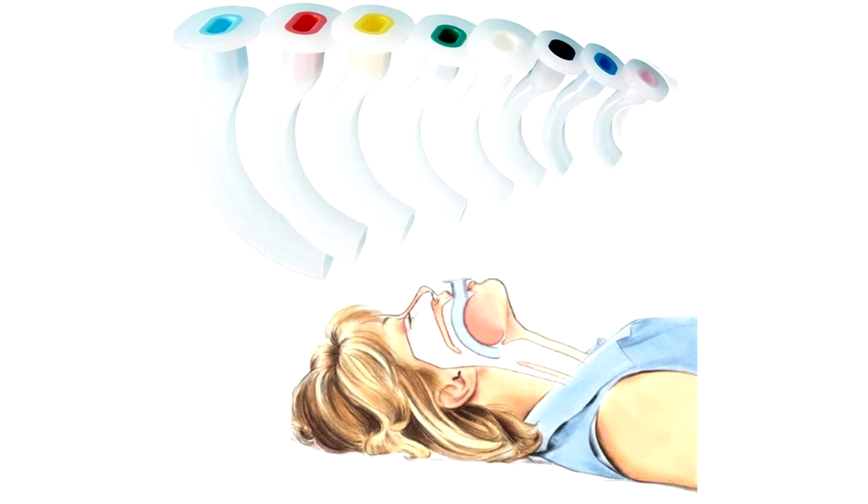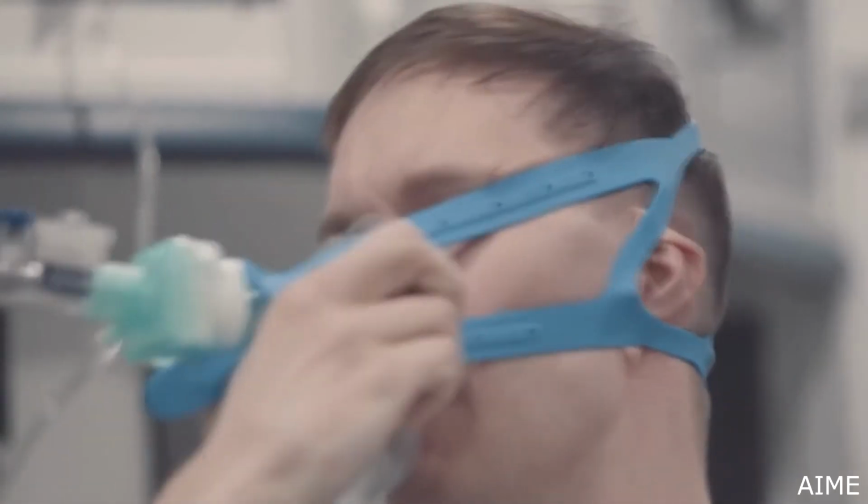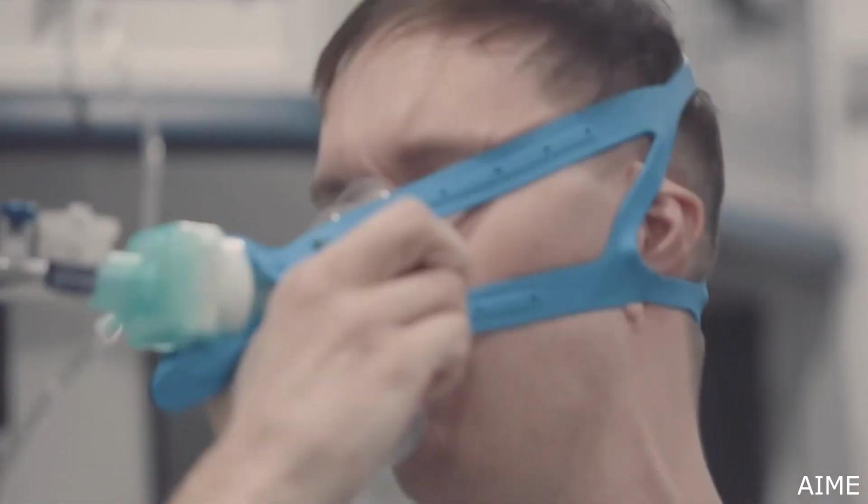While you may think about using an oropharyngeal airway for this, in COVID, its use is controversial because if your patient is not completely paralyzed, they may cough when you try and insert the OPA. This is less of an issue for reoxygenation between intubation attempts if needed. Remember that with any CPAP, if your patient is awake, you will need an anxiolytic.